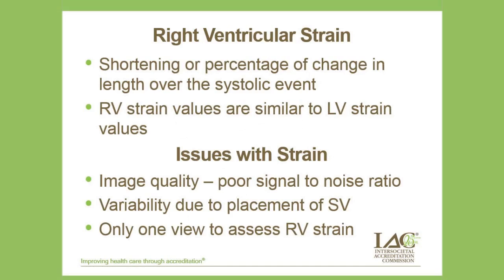Okay, the next thing we're going to talk about is right ventricular strain. I know we get to do a lot of left ventricular strain on our chemotherapy patients, so now we're introducing strain into the right side of the heart. I don't think any equipment companies, and I could be wrong here, really have right ventricular strain. I think there is one that you can do after the fact on a different type of software.